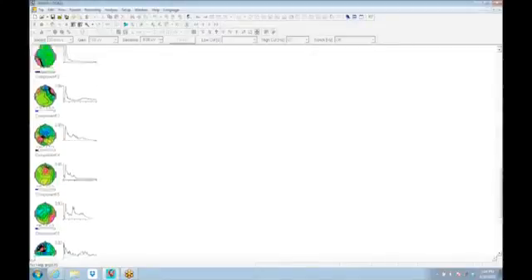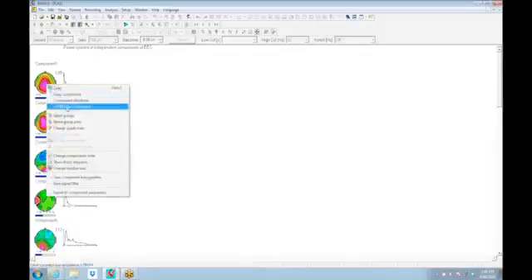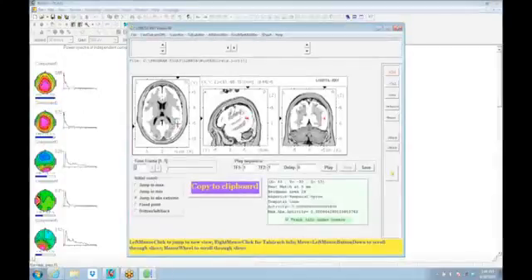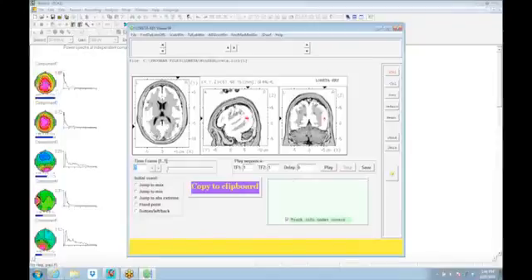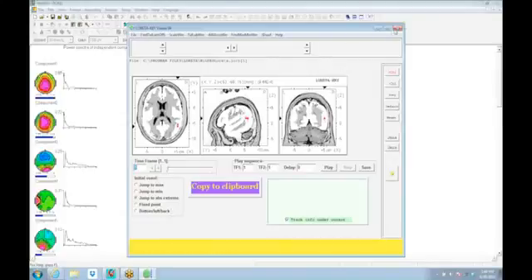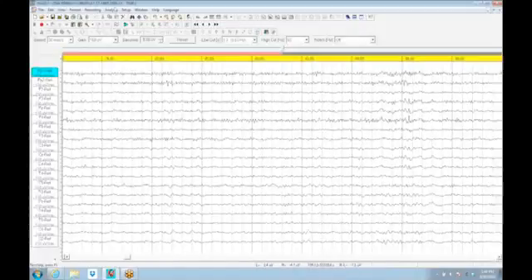But the decomposition of the EEG ends up identifying individual generators. Here's a low grade of alpha with a lot of low grade slowing, and it's one of the largest spatial generators, and it's basically something coming off the right temporal area as a focal generator. Anyway, this kind of software analytic is available, again, under analysis. And this EEG analytic software has a lot of capability.